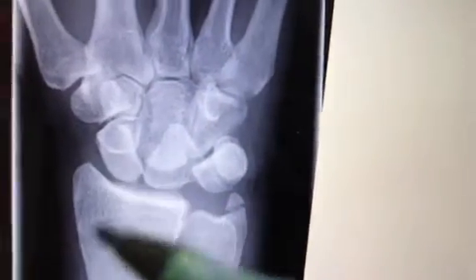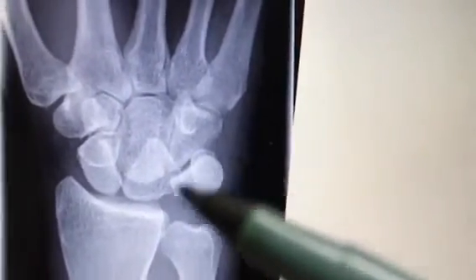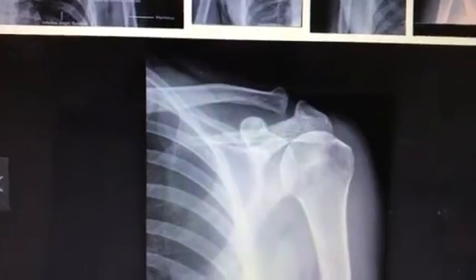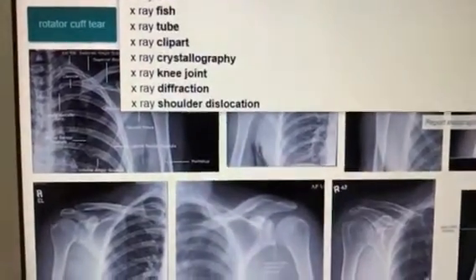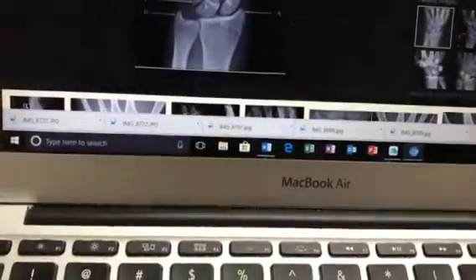Okay, she looks too pretty. You'll see some other bone. Just hold on. X-ray. You have already seen the wrist joint. Yeah, we'll see this. Okay, so here you could see that.